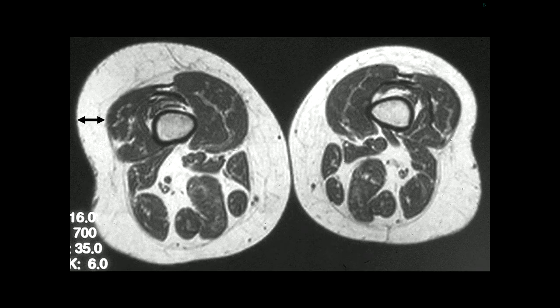So by getting involved and looking at it as it's being done, now we have the study where we've really only done 3 sequences, but yet we've not only shortened the exam, not required to give contrast, and can make a definitive diagnosis of lipomatosis of the lower extremity as the source of the patient's presenting complaint, really doing our job and certainly making it easier for the patient and requiring less imaging time.